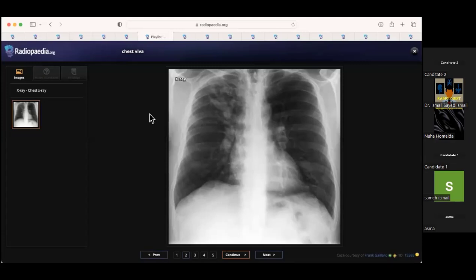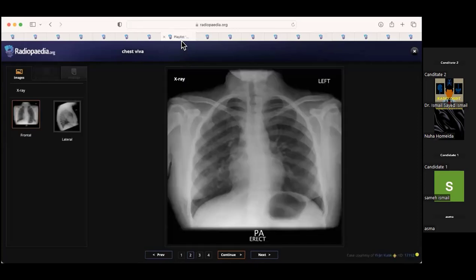And ultimately, bronchiectasis, do you know how we diagnose it? On imaging, we can do a CT scan, but it's a little bit of increased radiation. So the ultimate modality is, you're right, CT, and we do HRCT because it's most accurate. Radiographs are not ideal, and won't tell you how extensive it is, but we tend to do HRCT to see how extensive the changes of bronchiectasis are.